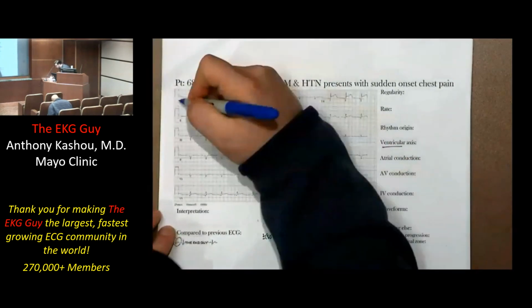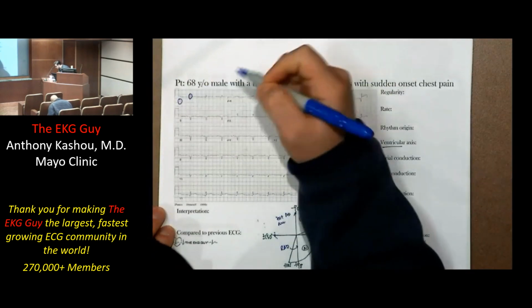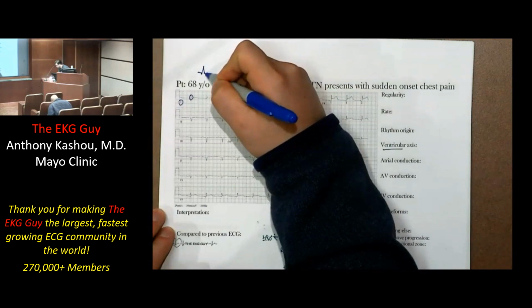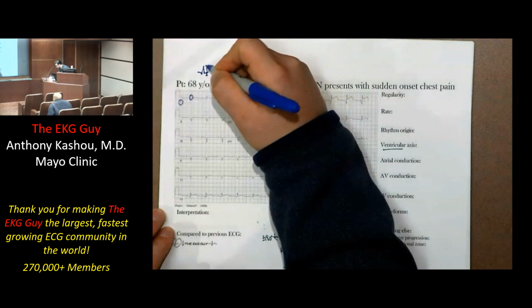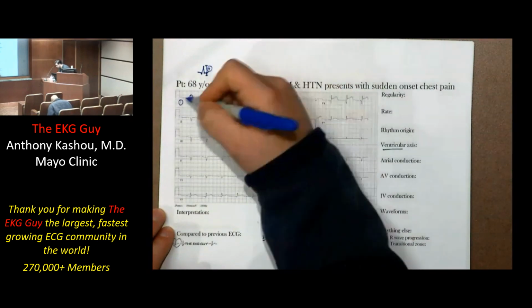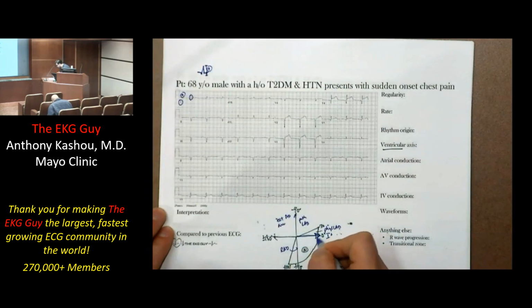So when we look at lead 1 is here, and they're hard to make out, but these are clearly positive. You can pretty much see a deflection that looks like this. And what I'm comparing is the deflection downward to this R wave, the Q to R wave. You can see that this is mostly positive, so I just call this positive, and we're going towards the positive end of lead 1. So positive towards that direction.